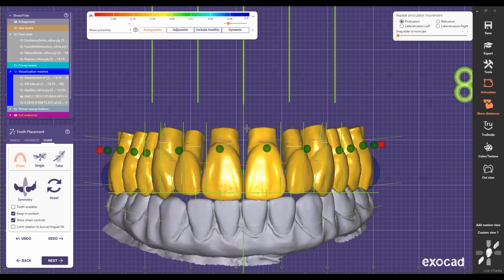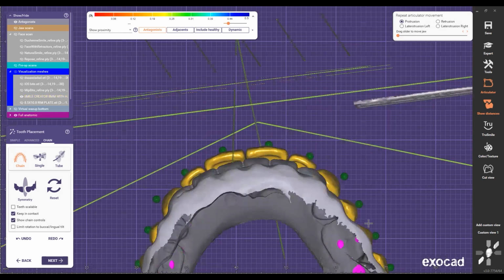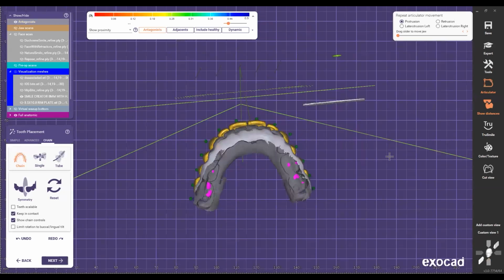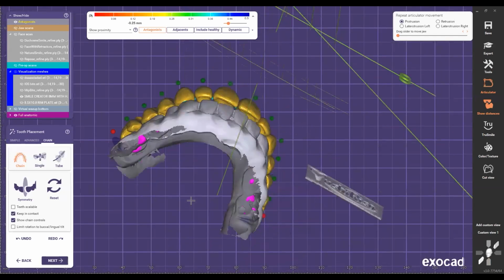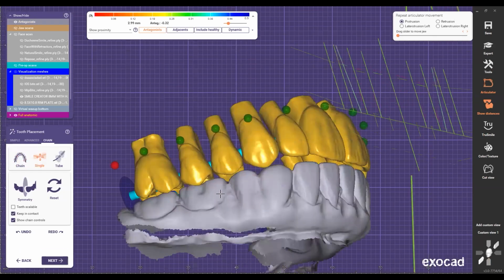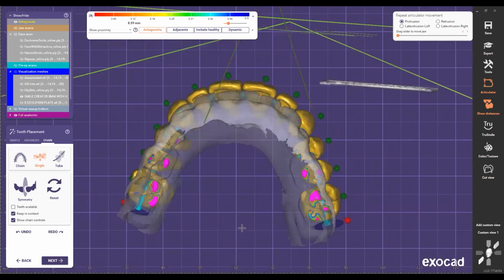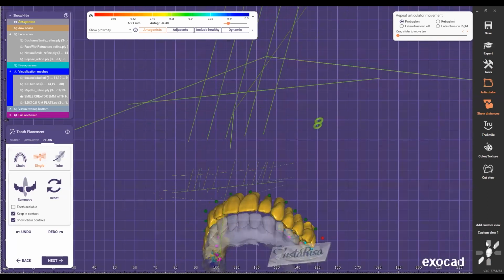Okay, so now I'm gonna push him in a little bit, so I can close that gap as much as possible. So I'm gonna move everything back from here, and I'm just gonna go tiny in. And I'm just gonna lock everything in the back, so nothing changes. So now I can go here little by little, bring them in occlusion, bring everything down. Then I'm just gonna bring everything here, everything there. I put this one and this one higher. So possibly the anteriors are gonna be out of occlusion.